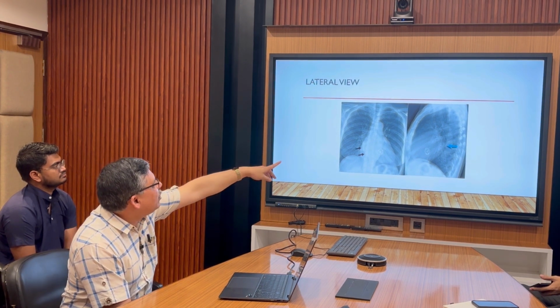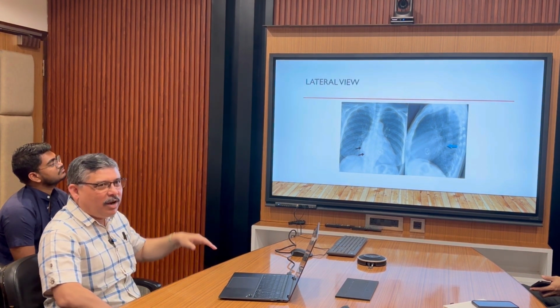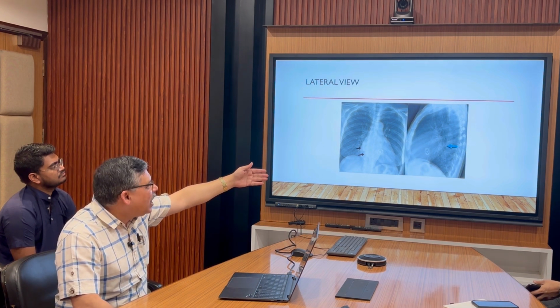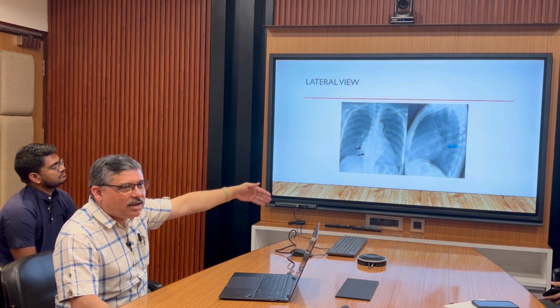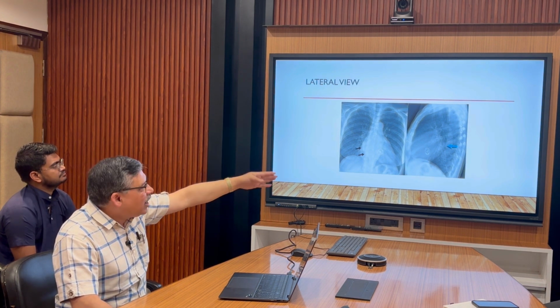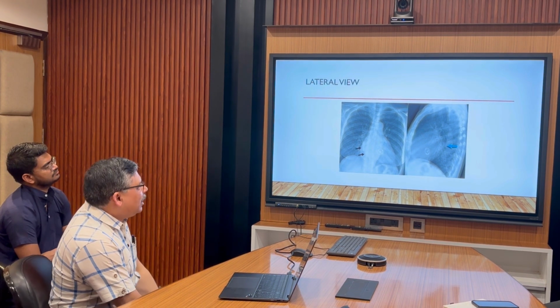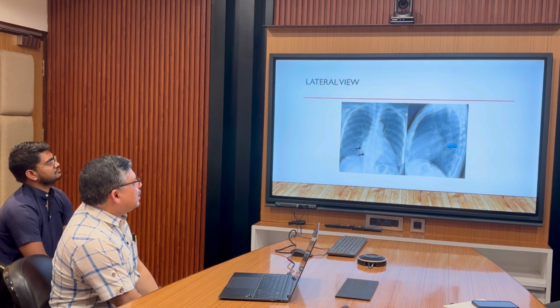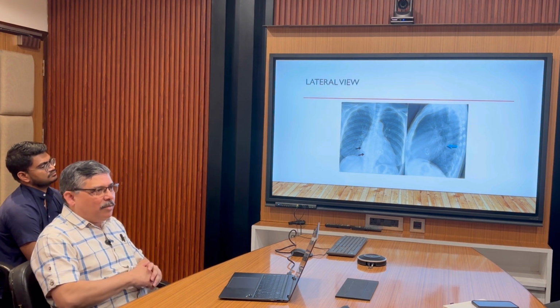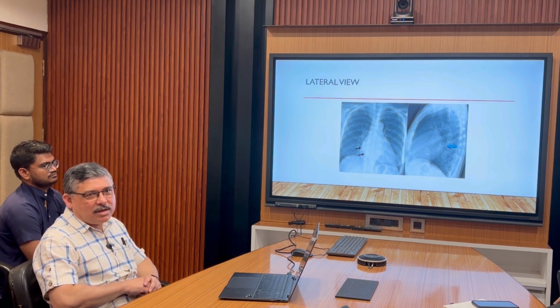So you can also make out the sternal clips. Once an X-ray like this is given, you will give a description of the whole thing. So bones, you see the clips, the heart, you see the aortic arch nicely. You can make out the left atrial bulge, and on this side you see double contour of the right border of the heart, and you can make out there is a dense structure which looks like a prosthetic valve. Okay, nice, good.